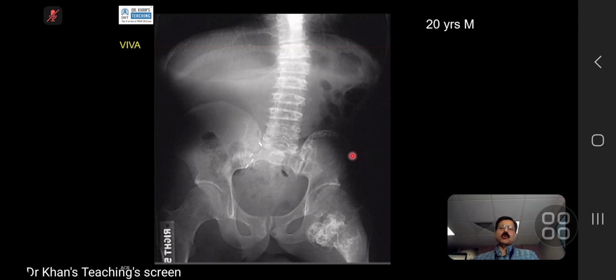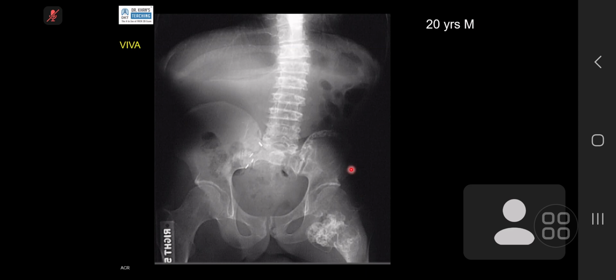I want you to tell me what is the difference between this iliac bone versus this iliac bone? Yeah, I can see that there is decrease in the size of the left sacral and iliac bone in comparison with the right side. Because of that, I will see if the patient is a known case of paraplegia or has any spinal tumor before.